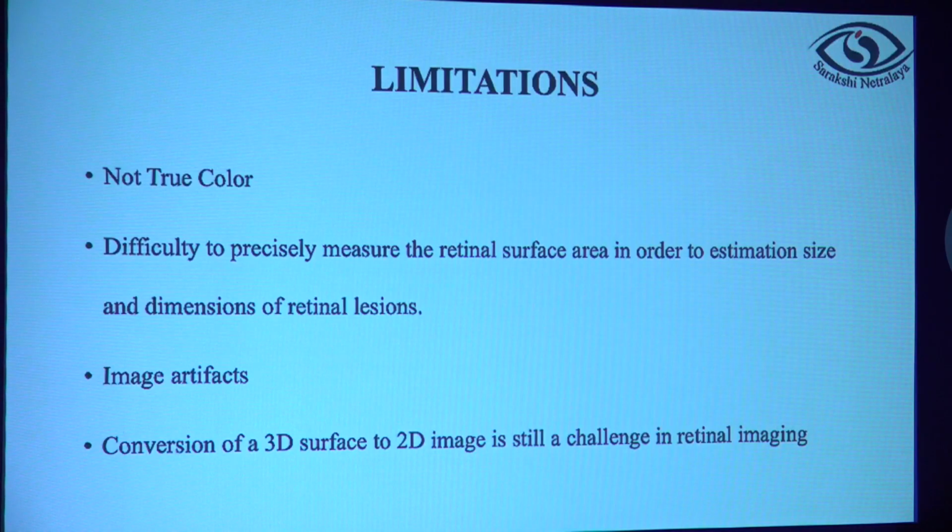This is decompression retinopathy. Well, it's not true color because these are SLO based. And sometimes, as already said, with 3D surface to 2D, the sizes of the lesions might be slightly different.